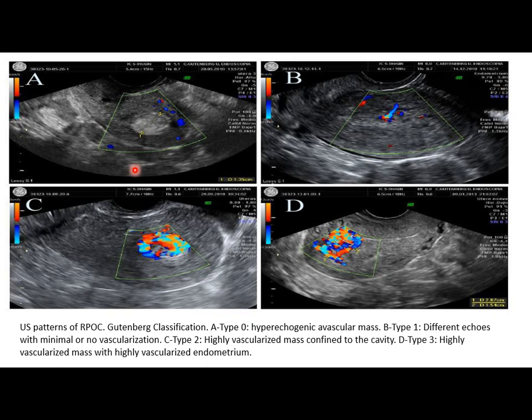About retained products of conception: it means retained part of the placenta or membrane within the endometrial cavity, and we have four types of vascularization of retained products of conception. Type 0 is avascular; the retained piece is avascular, or we can say it is more a blood clot than retained placenta. In type 1, there is just an increase in the vascularity of the endometrium relative to the myometrium.